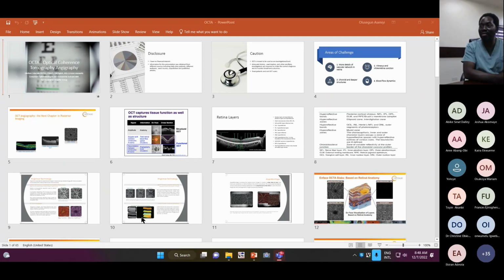But if I see foveal avascular zone changes, I'm going to write the physician to let them know that I'm going to do some functional changes so the patient can ensure better control, and also other risk factors, systemic hypertension, lipidemia, and so it helps us to manage these patients strictly. So the patient won't be given 9 months to come back. I will see him closer, I will monitor him closer.